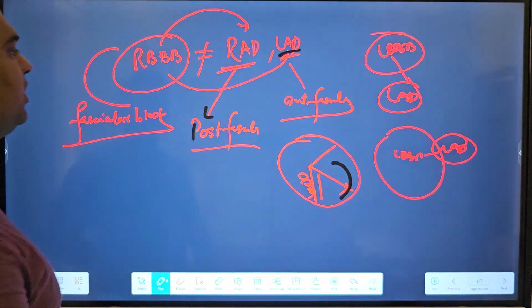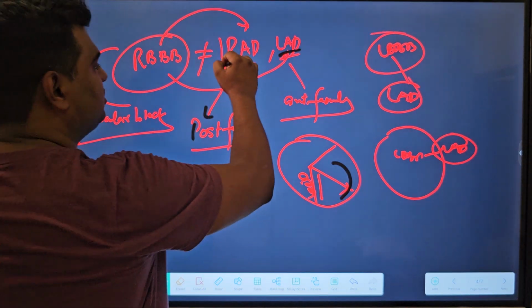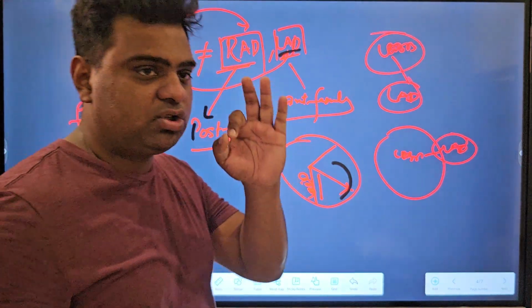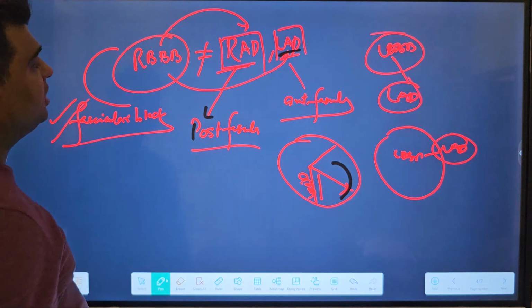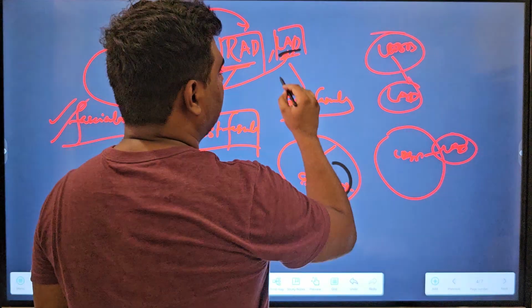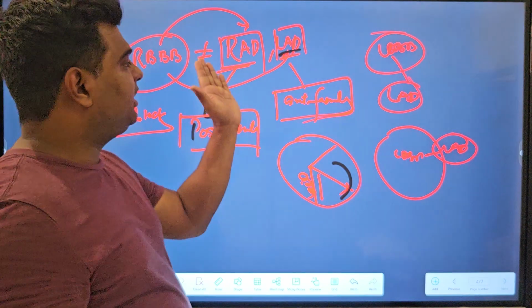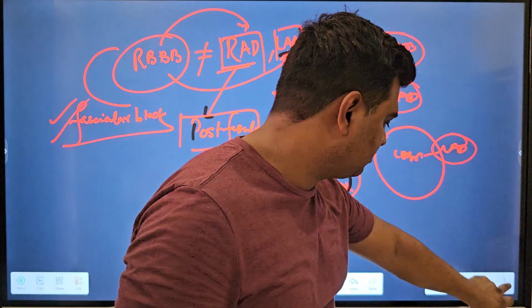So this is a very important point. Whenever in an ECG of right bundle branch block you are seeing right axis deviation or left axis deviation, you should always keep in mind that yes, this patient can have a fascicular block. If the patient has RAD, the patient has a posterior fascicular block, and if the patient has a left axis deviation, then it can have an anterior fascicular block. I have already explained in detail the causes of right axis deviation and left axis deviation.